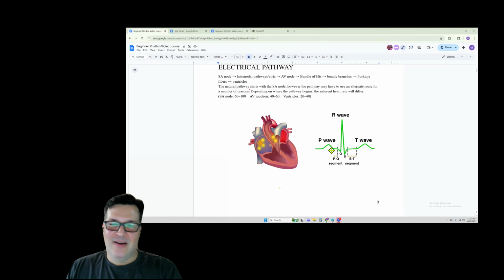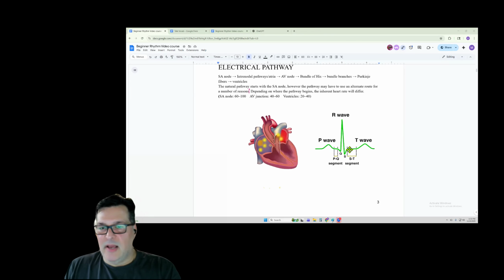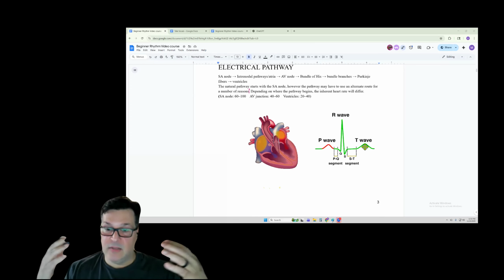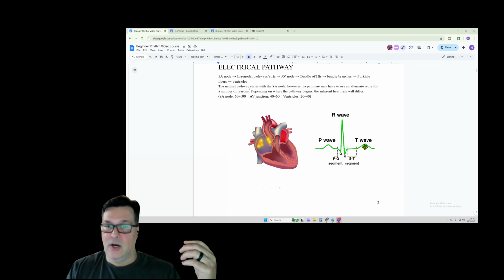So you have the PR segment, which allows the right ventricle to fill full of blood. Then you have the QRS complex that represents the contraction of the ventricles. The right usually goes first, then the left. Then you sometimes have a little isoelectric baseline after the QRS, before the T wave starts. The T wave represents the repolarization of the ventricles. That is the cells, the chemicals exchanging places back to get ready to charge again.